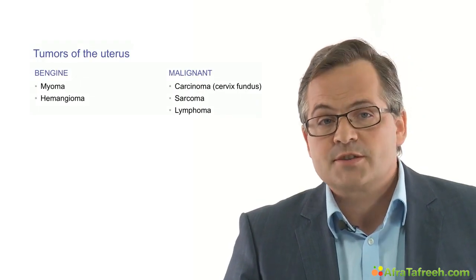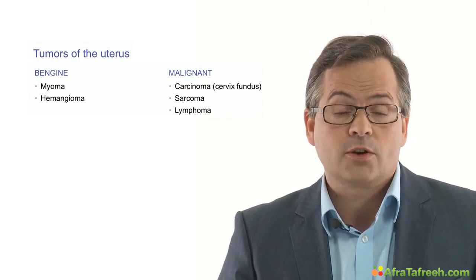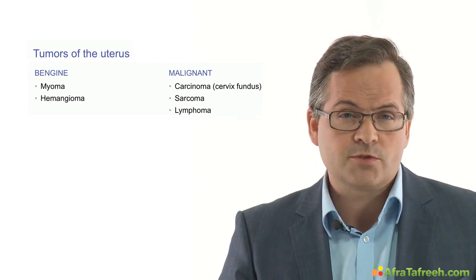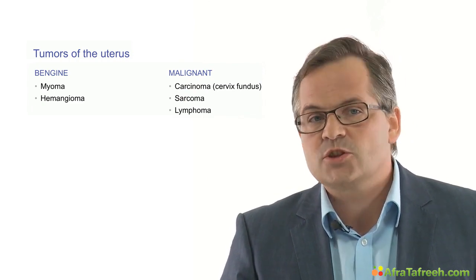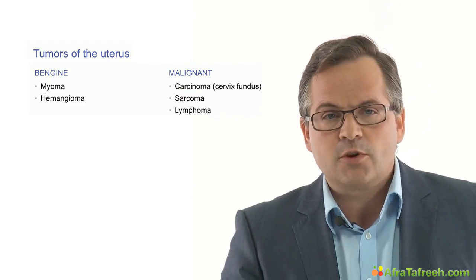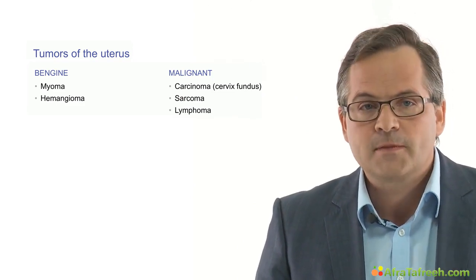Tumors of the uterus are, amongst others, myoma, rarely hemangioma, or sometimes malignant tumors such as cancer of the cervix or the corpus. Hypoechoic areas within the uterus are an indication of liquid or blood. Hyperechoic areas indicate some tissue, for example endometriosis. Very hyperechoic reflexes in the form of a flat line with reverberations are indicative of a coil.